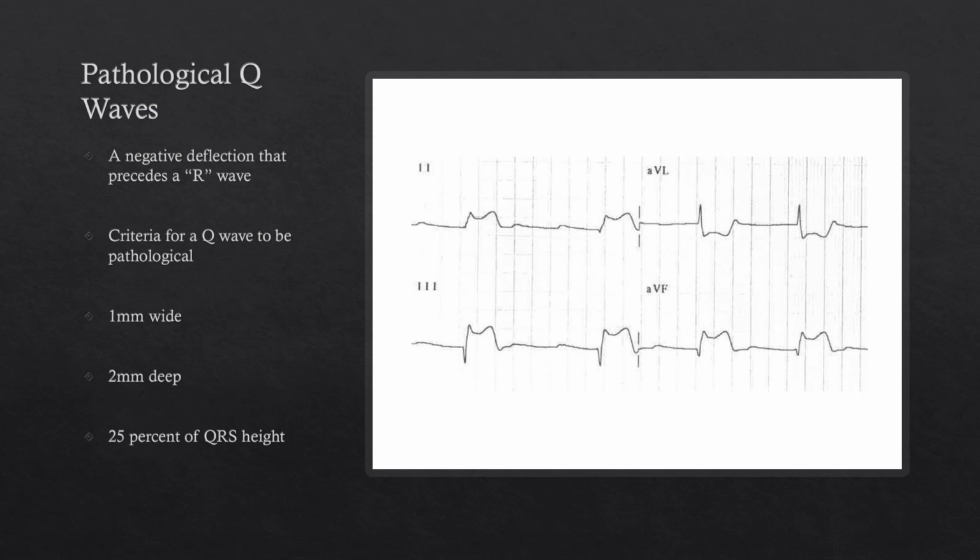So moving on down our checklist, we've talked about ST elevation, ST shape, and hyperacute T waves, adding in De Winter's T waves as a subset, and now we have our pathological Q waves. Out of all the ECG criteria, this is a very specific and sensitive test for a myocardial infarction. The problem is that once the Q waves form, they often persist. In the case I'm showing you here, it's pretty obvious because along with the Q waves you see ST elevation and reciprocal changes, etc.